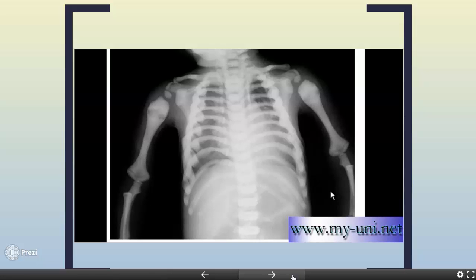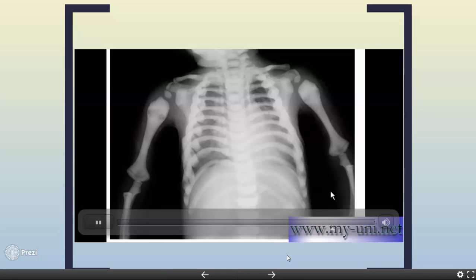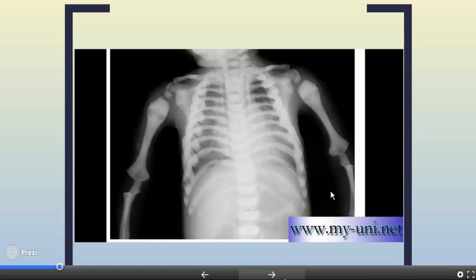One might think that these bones should be very strong, but reality is exactly opposite. These are very brittle bones that are very easy to fracture. The topic is very broad, which is clearly beyond the scope of this small video, and also the list of conditions that can cause diffuse osteosclerosis other than osteopetrosis is quite long, and the purpose of this small video is to describe the most common radiological features of the condition known as osteopetrosis.